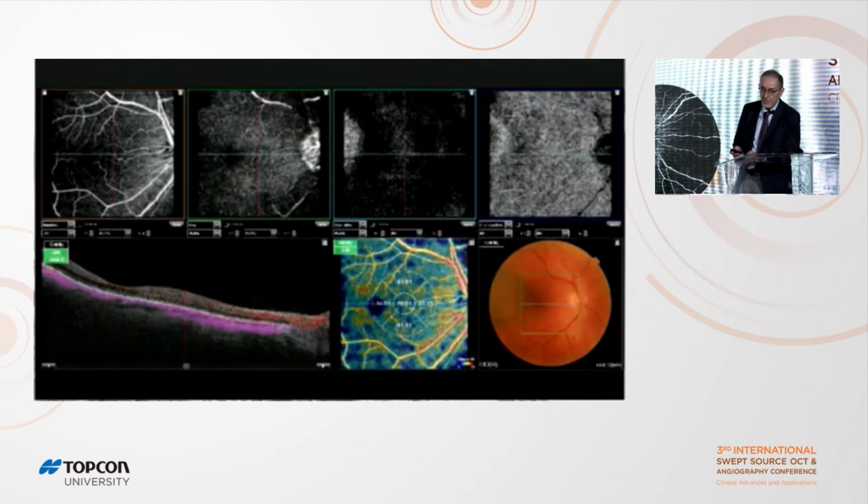And this is the OCTA image. Again, we were unable to image the lesion in its entirety because of out-of-range errors. And this time, there are changes in the outer retina as well. Here you can see a hyperreflective network in the outer retina and choriocapillaris layer. And so this is different than choroidal nevi. Choroidal nevi usually don't have any changes in the outer retina.